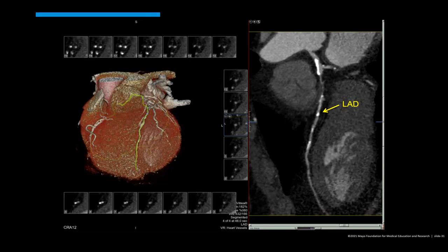And so that's where the positive comes from. You'd have this atheromatous plaque that's inflamed and bulging out into the epicardial fat before you get any luminal narrowing. Now, in this case, it's a little bit more advanced because we also have luminal stenosis. So the positive remodeling just refers to the outward bulging of the vessel wall due to the presence of that inflamed atheromatous plaque.